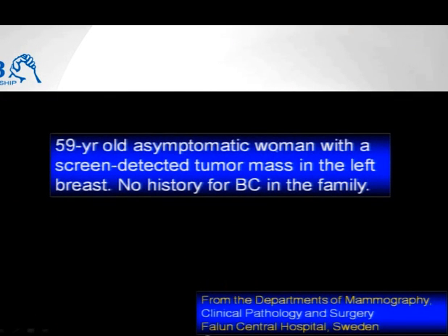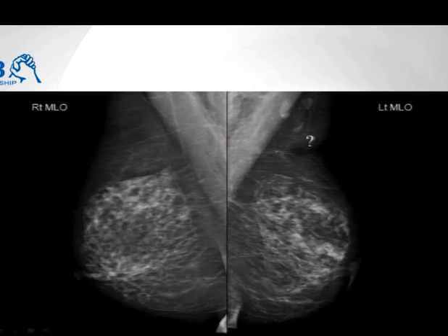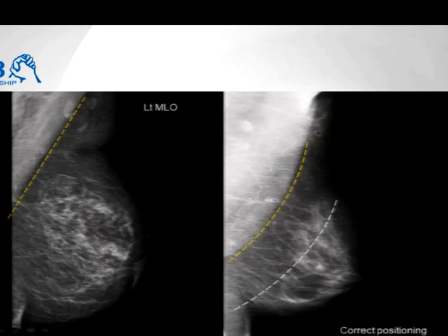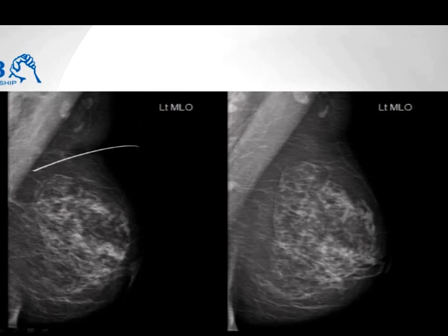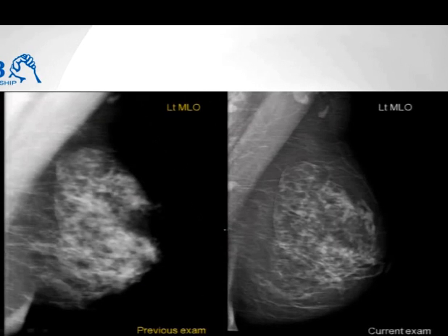Here is the first example that shows what a mistake we can make. You can be the best mammographer in the world. You are going to miss the cancer because it's not on the mammogram. You see, the pectoral major muscle should have been like this here. And 5 minutes later, should have looked like this. 5 minutes later, you have another picture, still not perfect, but this case has a cancer. Improper positioning, proper positioning. And mind you, there will be a 7 centimeter area here with cancer in situ.